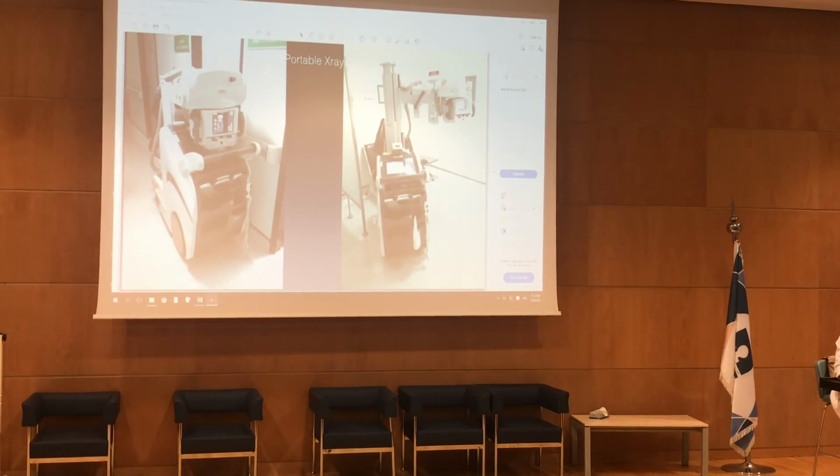Okay, so those are portable X-ray machines. They're similar to the ones we've seen in the X-ray suite, but they're portable, they're smaller, and easy to move around, and this is what the technologist will take to the inpatient's room and the ICU, so that they can take the images there without moving the patient or bringing them down. Patients who have to stay monitored, or have fear of infection, or are the source of infection, for all these we use the portable.